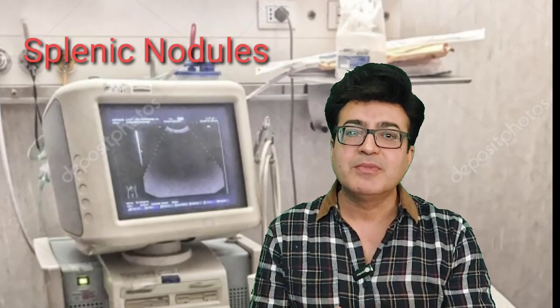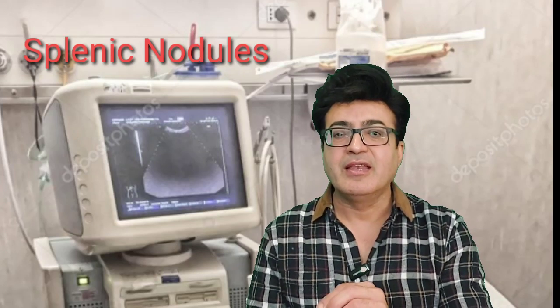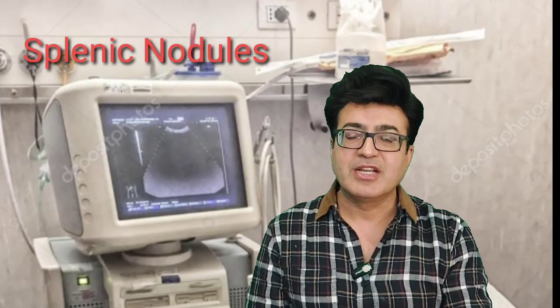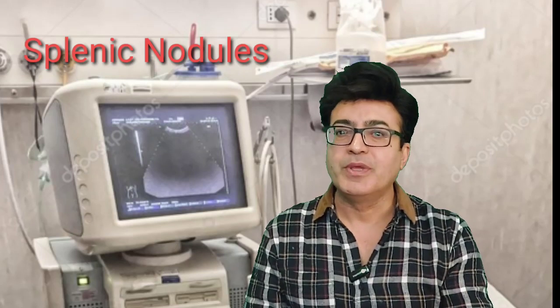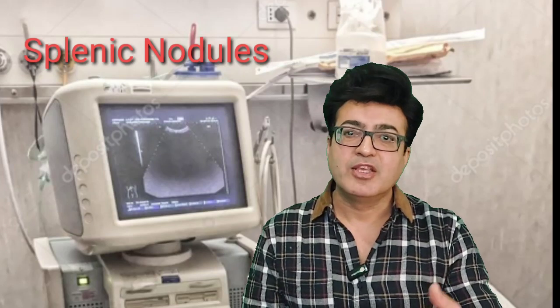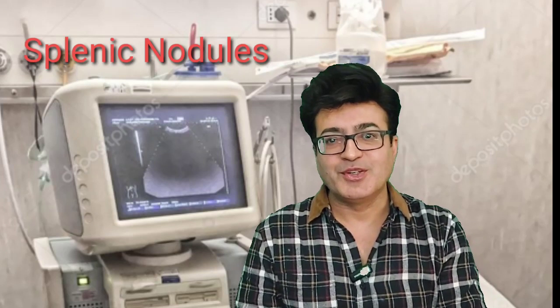You have to be very smart while writing the differential, keeping the patient history and the characteristics of the lesion on ultrasound in view. It would be good if your differential is up to 3 diagnoses, and if you can extend, you may go up to 5, but it is better to have three diagnoses.